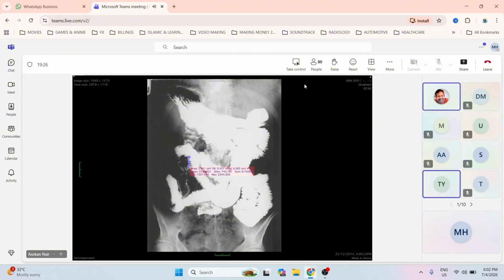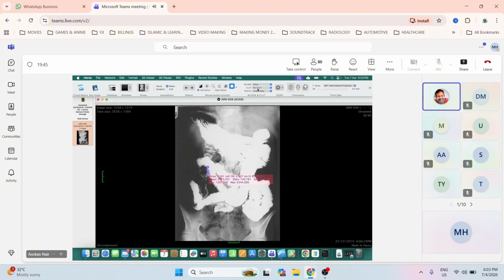Yes. And what other organs can get involved in scleroderma? The lungs. Can you see the lungs here? Yes, there are reticular changes, also here, bilaterally in the lung. So there's a honeycomb appearance there. See, there are other things that support your diagnosis. That's what you must do in the exam. This is a full house for the whole thing. Okay, thank you, Dato.